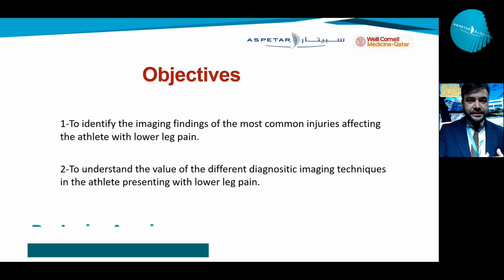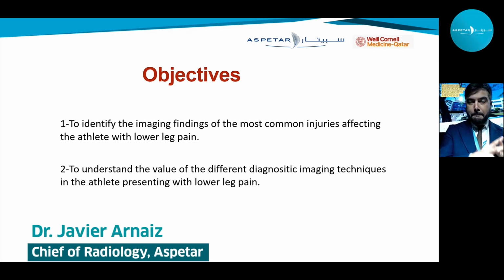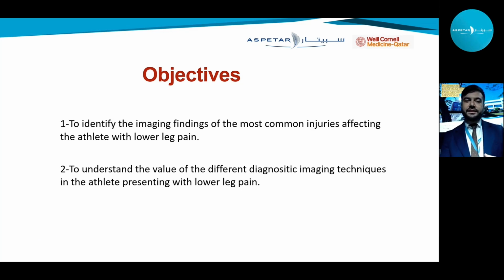The objective of this session is mainly to identify the imaging findings of the most common injuries affecting the athlete with lower leg pain. I will also try to show the value of different diagnostic imaging techniques in athletes presenting lower leg pain. After this lecture, we should be able to choose the most appropriate imaging technique when we have a patient with this type of pain.